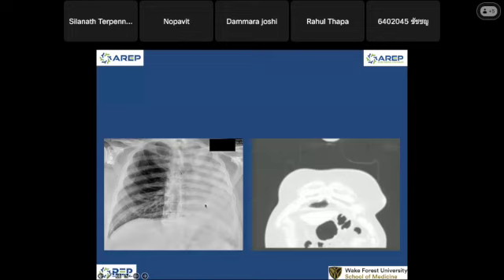What I know is there is opacity everywhere, and the trachea is shifting. And I cannot see the heart. I don't know where the heart is, maybe somewhere in here in the left lung, and the trachea is shifting. So this tells me there is lung volume loss in the left. So it is pulling everything to it. What causes lung volume loss?